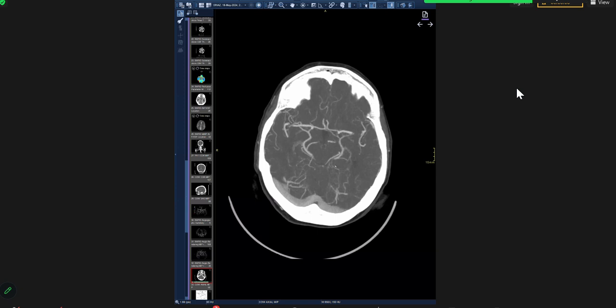So vessels are normal. Yes. Okay, what I can see, the vessels appear normal. Now what do you want to do next?